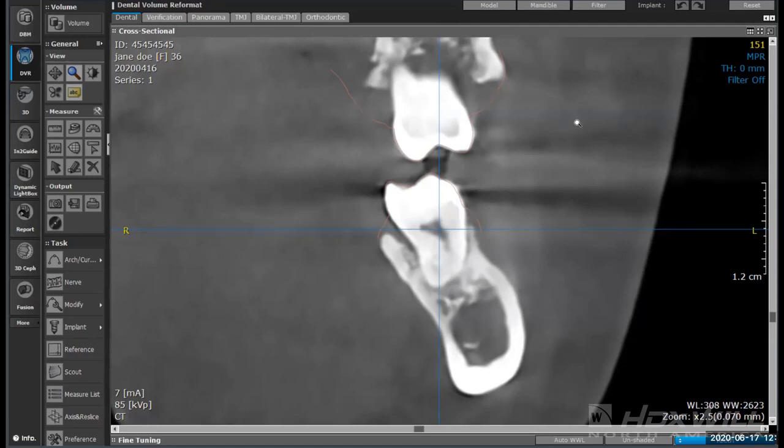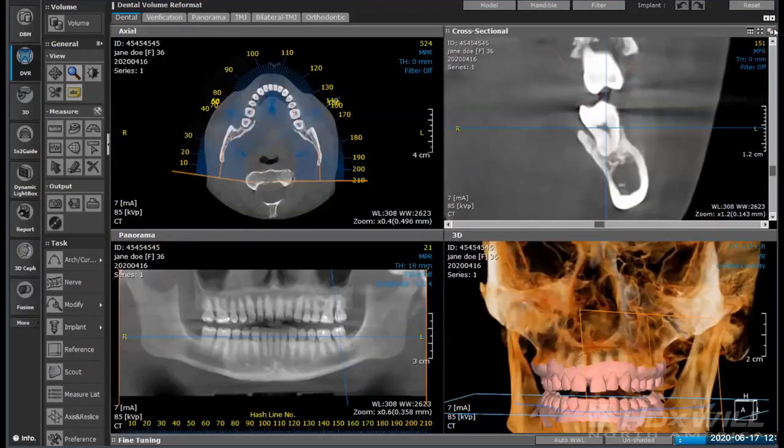It'll also help you in choosing maybe an abutment or a healing cap to put on top of there, so that you can know the height of what you need so that it protrudes through the soft tissue itself. So a lot of good things involved in that. It really is a fairly simple procedure to do.